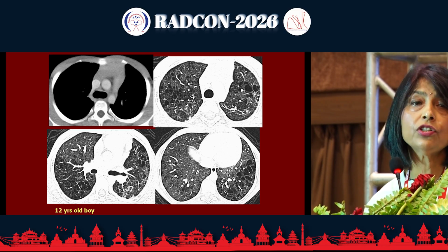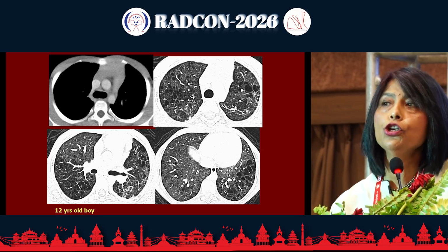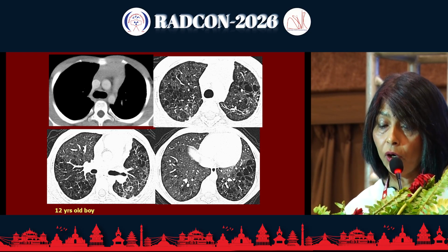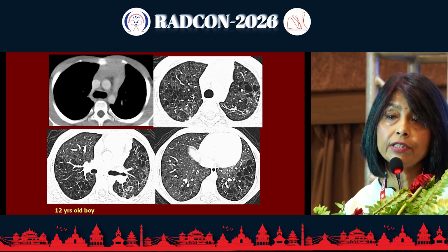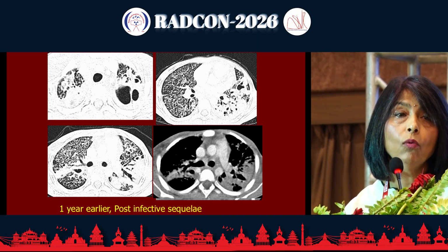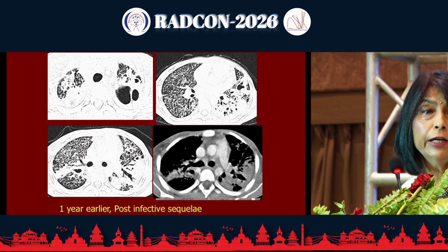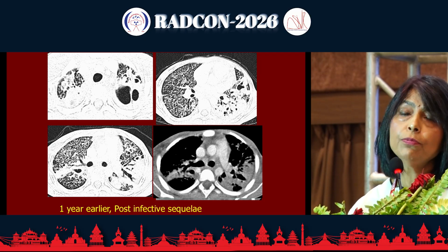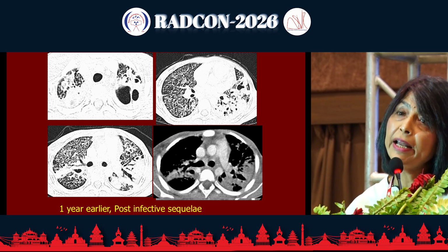So you may start racking your brains and saying, should I label it as an LCH, or do you think this can be a LAM, till I see the previous CT from 1 year back, when the patient had microbiologically proven tuberculosis and was treated with ATT. Remember, tuberculosis will leave this signature many times.